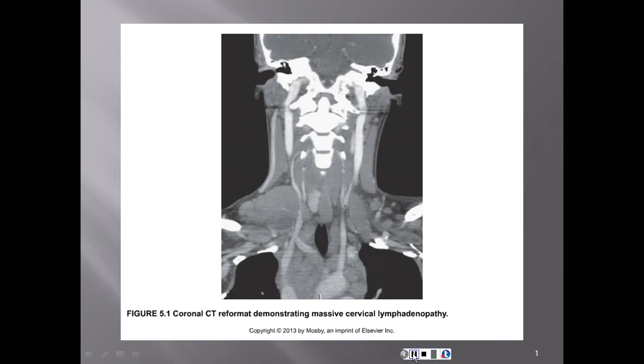For example, if a patient has difficulty handling their oral secretions because of prior head and neck surgery, particularly following tracheotomy or partial glossectomy, they may have significant hardship laying still for the time required for MR scanning. In such cases, the rapid imaging time of multi-slice helical CT is more likely to yield a study unmarred by motion artifacts.